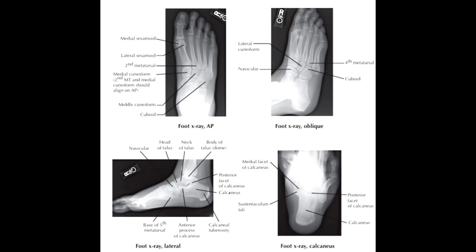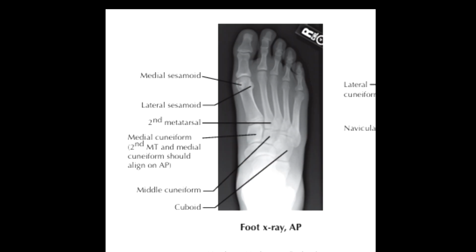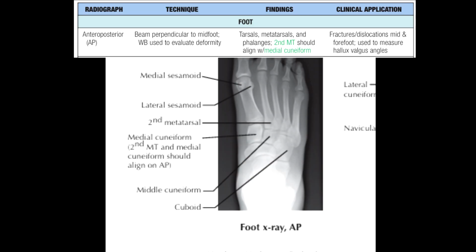In this section of our lecture, we turn our attention to the radiographic evaluation of the foot. Radiographs of the foot may appear simple at first glance, but each projection reveals a wealth of anatomical and clinical information. By mastering these views, one can diagnose fractures, dislocations, deformities, and subtle injuries that would otherwise be missed.